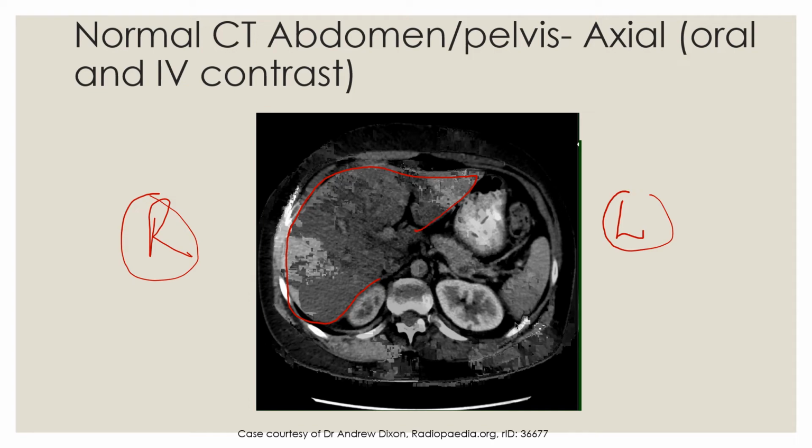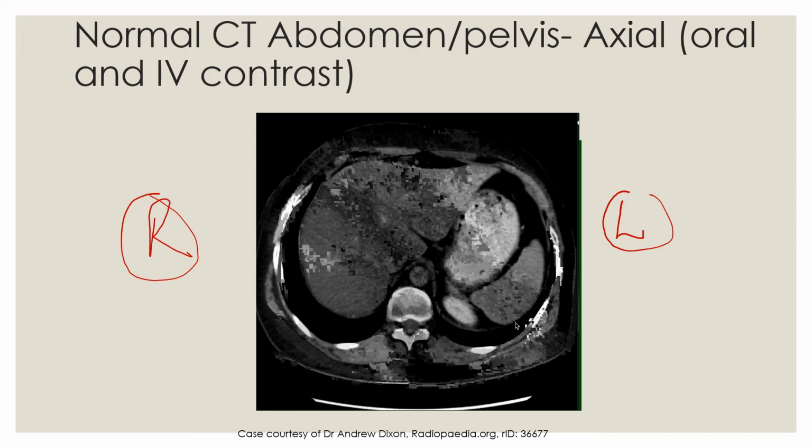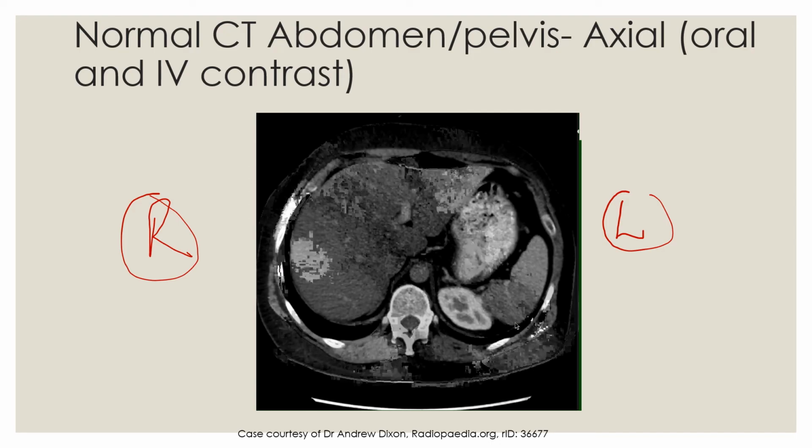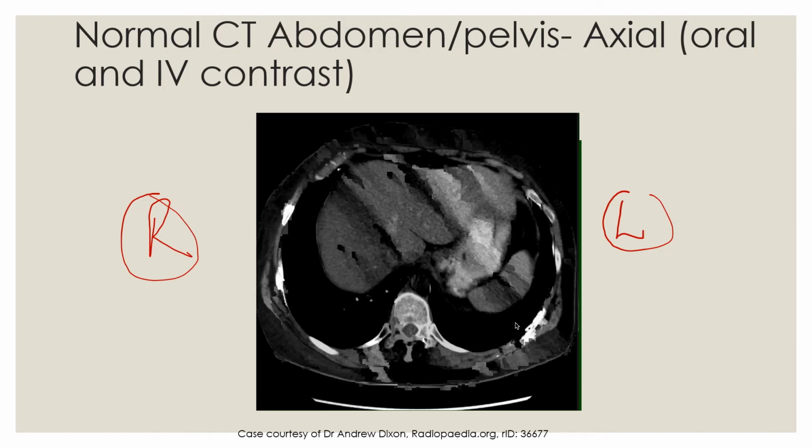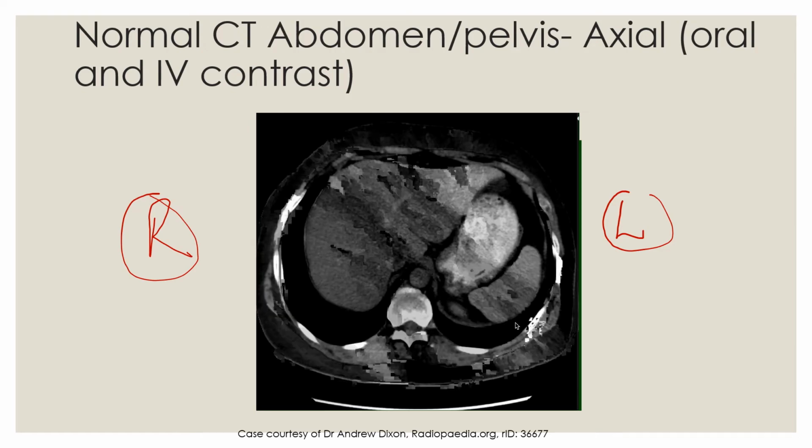What we can see of the liver is that the IVC is here, and the hepatic veins will be coming like this. Your hepatic veins will be divided into the right, middle, and left. See if you can note them out when I scroll up and down. You may not, because the hepatic veins are not well opacified in this study. But see if you can notice things coming into this structure here. If you do notice them, those are the hepatic veins. So you can see all the way at the top, those are some white structures coming in. Those are your hepatic veins.